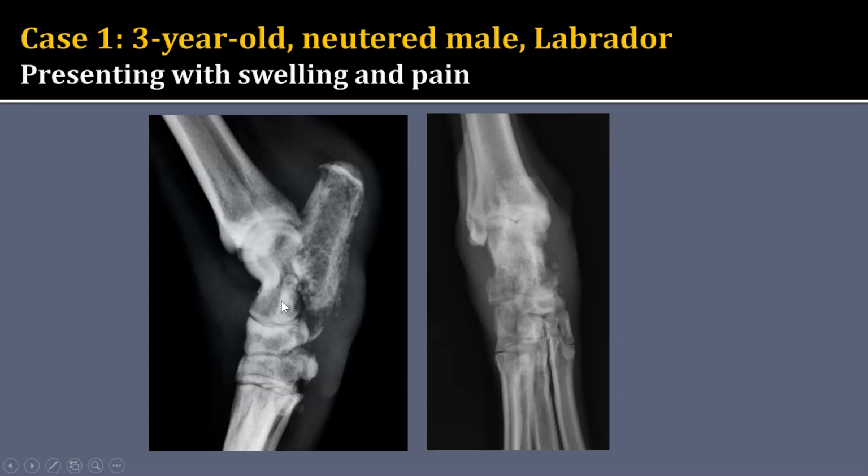In the calcaneus, pretty much diffusely, I see probably a combination of permeative and moth-eaten lysis, and notice that the lysis, especially the permeative, is affecting the cortices. Best seen on this lateral view. The remainder of the bones are all normal. This trabecular pattern, the lucency in the center of the tarsal bones, that's all normal. So really my only abnormality is of the calcaneus.